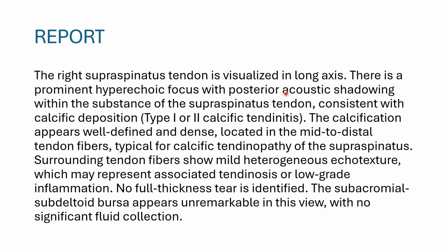The shadowing in our case is not quite prominent. You can visualize it in certain angles, but it all depends on how you visualize. If you don't see significant shadowing, you can still report it like that. There are very dense calcifications. There are also very light or soft calcifications, which don't really present with posterior acoustic shadowing.